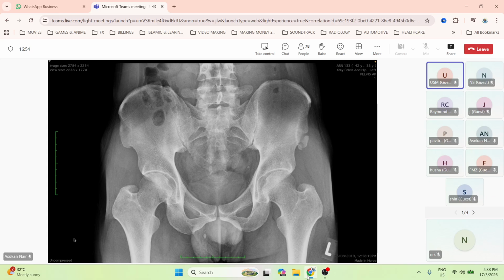The muscle which is attached to this part of the bone is the sartorius muscle. Yes, okay. So this is the avulsion fracture at the sartorius insertion. All right. So in the exam, they may ask you about certain places where avulsion fractures occur. So you need to know what is attached in those particular places.